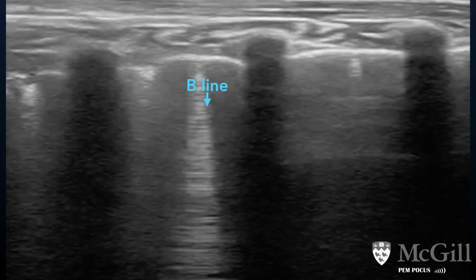Here is a picture of a B-line. In adults, a depth of 8 cm is required for a B-line, but in children, given the different sizes of pediatric patients, such a cutoff cannot be used. In general, the vertical projection that comes from the pleura needs to reach the bottom of the screen.